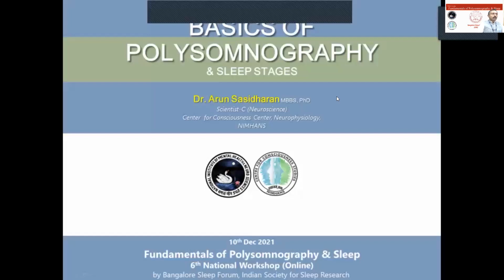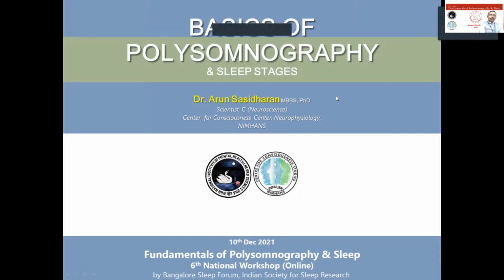Welcome back. So we'll continue with basics of polysomnography and sleep stages. So you've already gone through the animal sleep EEG patterns, and from yesterday you have already seen some EEG patterns that are specific to humans. So I hope it's getting slightly clearer.